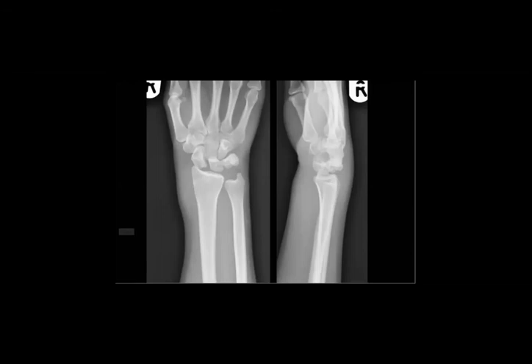Let's make this last one before we go to stage 3 tonight. Yeah, perilunate, Nermeen, perfect. Perilunate dislocation.